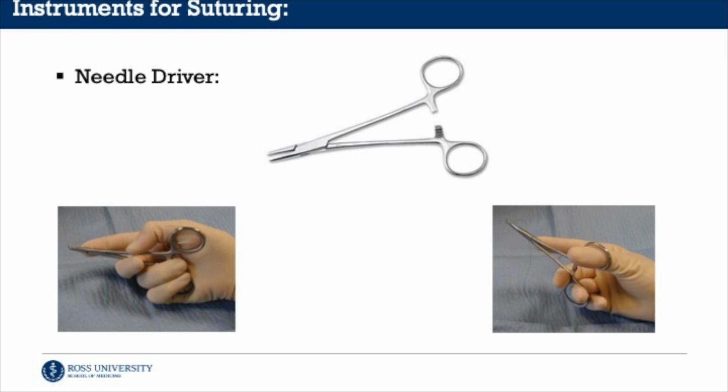Here's our needle driver. There are multiple ways to hold the needle driver. There's the palming technique, with the handles resting in your palm. Your index finger is extended and rests on the fulcrum of the needle driver. This allows for maximum mobility.